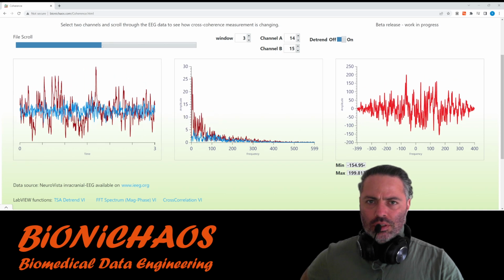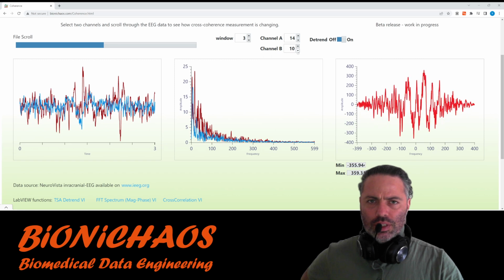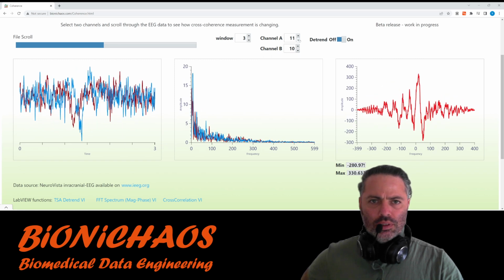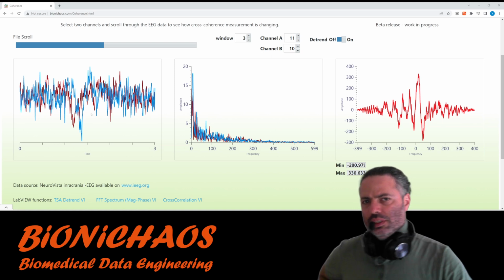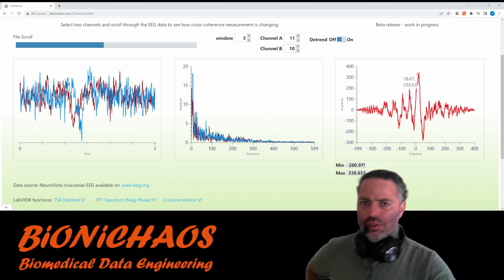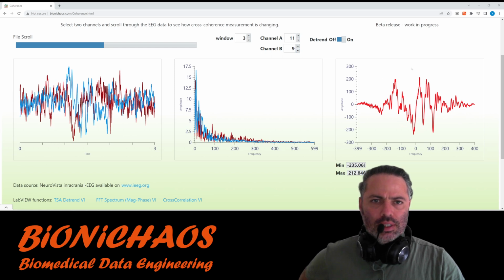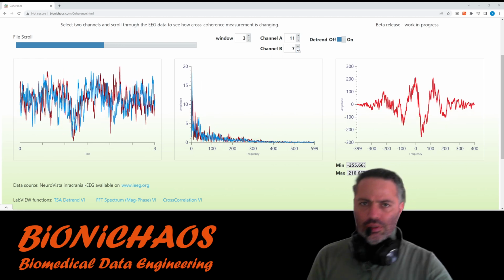See if we can find something else. Again, that channel is quite noisy, so select something else. Yeah, so in this case, you see this dip, and it's happening on both channels with about 18 Hertz phase difference. And same here, so that peak, 26 Hertz difference, I guess it's this one here, happening on both channels, but delayed over time. Yeah, you have that peak there, it's almost happening at the same time, but not quite.